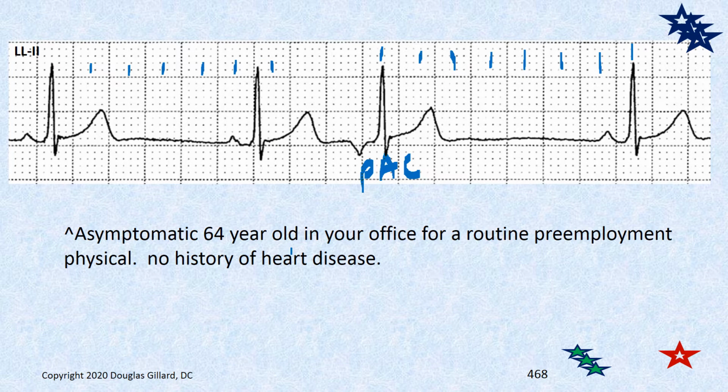But now let's look at the morphology. Tell me more about this. Well, let's look at the normal P wave. It's about one little box high. Now this one obviously is too wide, so that means it has a little traveling time across the atria, but it's inverted, right? So where do you think it's coming from? Well, right is upright, so it must be coming from the left atria somewhere, and it's taking quite a while to get across here. In fact, 3x5 rule, 1, 2, 3.